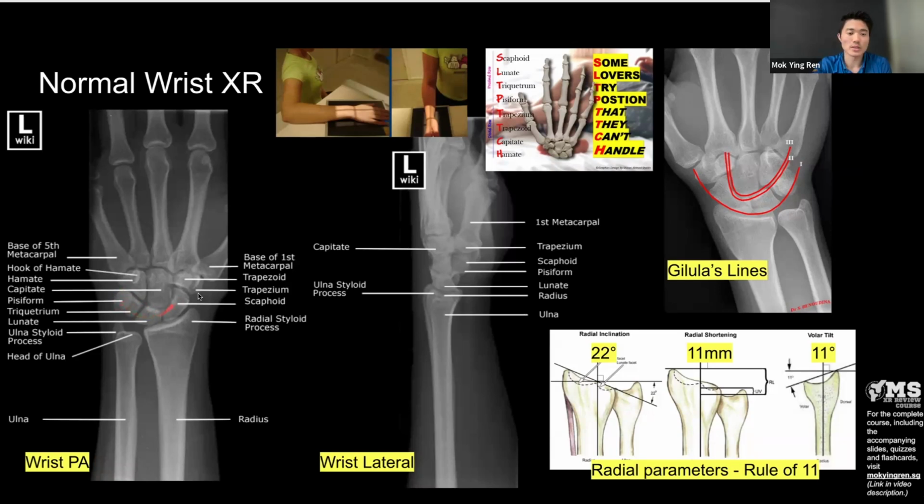And then going back to the thumb side again, with first bone is a trapezium. Because trapezium starts with a T and has an M, it is articulating with the thumb. Alright, trapezium. Trapezoid. Okay, the capitate is the huge one in the middle, and the hamate together with the small hook that you can see some overlap there. So this will be the carpal bones.